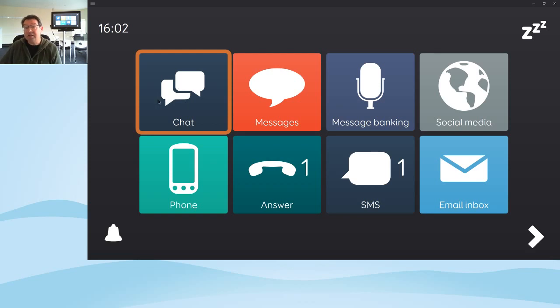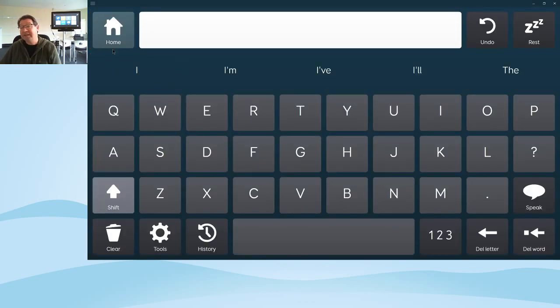This is the standard version, which works on a 10 by 6 grid, and you have the full QWERTY keyboard here, so you're able to type a whole message from this single grid. This is really good for someone who's got the accuracy to be able to use cells of this size. This is the most efficient layout, I guess.